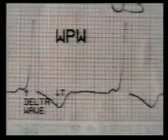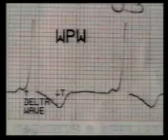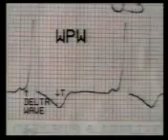This is another example of aberrant ventricular conduction in WPW syndrome. Note the delta wave, that is a slurring on the upstroke of the R wave, and the inverted T wave. All these are called secondary T wave inversions, secondary to aberrant ventricular conduction. They have no other significance.